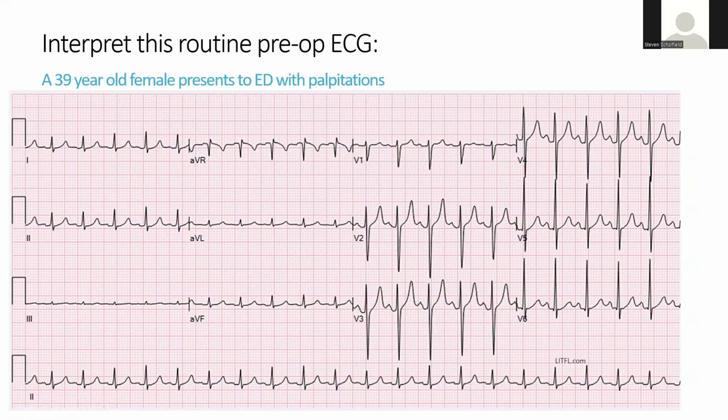Yeah, so my general process and what I've been taught and tend to do is, I like a systematic way. So first of all, you might look at the patient details, make sure it is the right patient. What time was the ECG taken? Do they have previous ECGs that you can compare it to? That's always very helpful. And then getting into the actual interpretation itself, so you can look at the rate, the rhythm and the axis, and there's sort of multiple ways to do that.